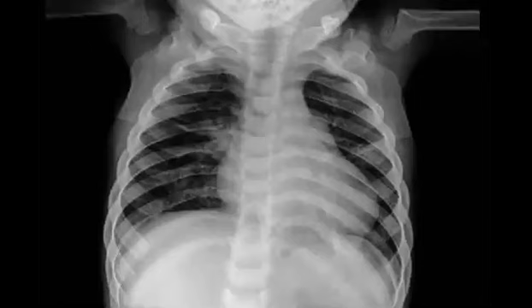And here, when you describe it, maybe they can tell you that there are some widened ribs. And as you see, the humeral neck here is far from the side of the scapula on both sides. So this is what is called varus. Yeah, so all the ribs look like an oar.